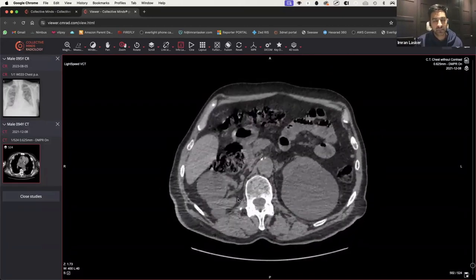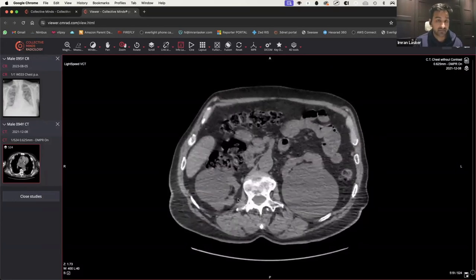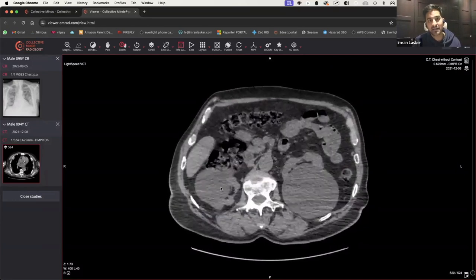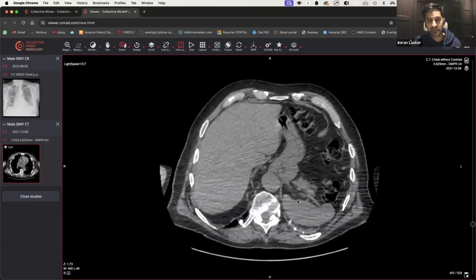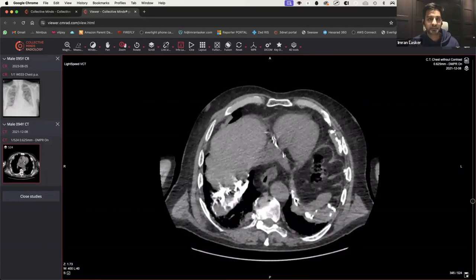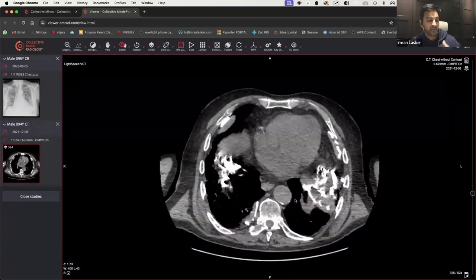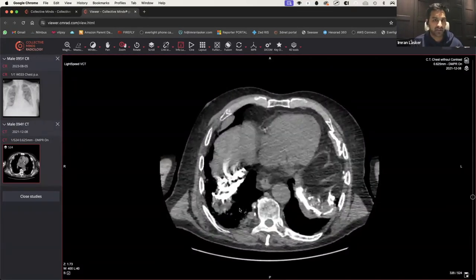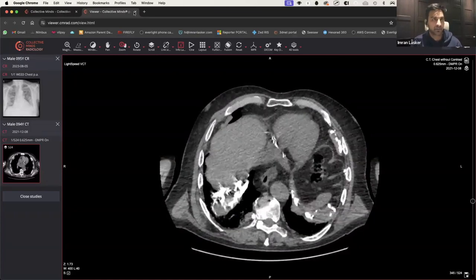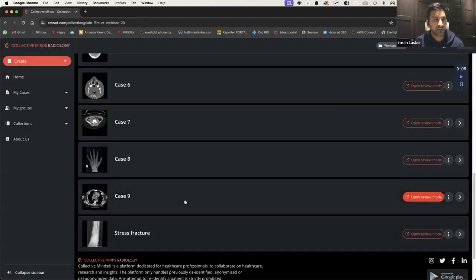Let's go to the very top of this one as well. Make sure we don't miss a renal cancer, because that almost happened. And yeah, these look like very well-defined renal cysts. The upper abdomen looks completely normal. So yeah, we could walk away saying this is not likely to be mesothelioma. There's a lot of breathing artifact and multiple pleural plaques, potentially some consolidation located within the right lung base. No other significant findings. Cool.